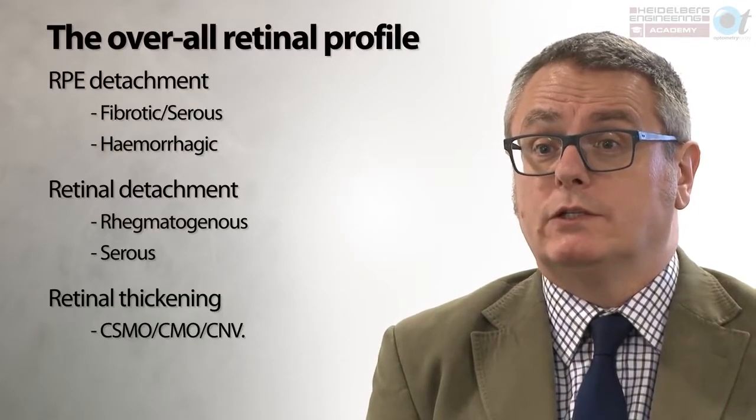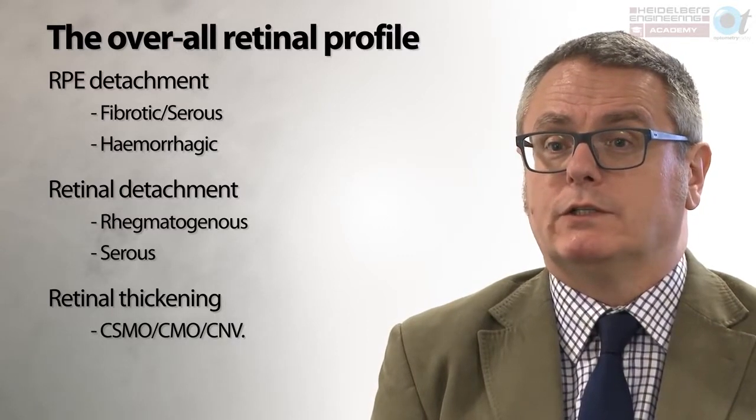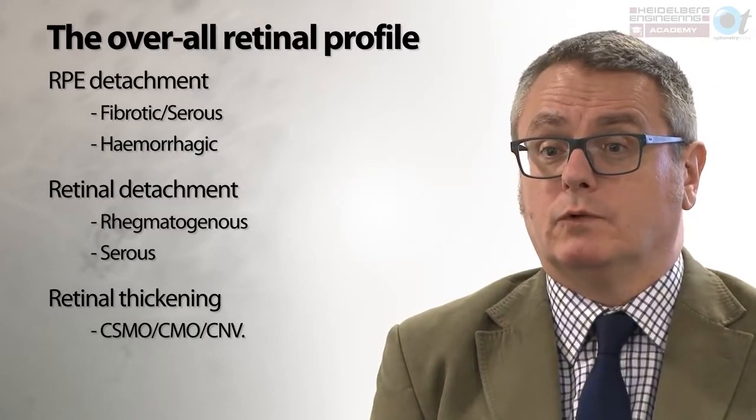What can cause changes to the overall scan profile? This list is not intended to be exhaustive, but this is the kind of changes you should be considering. Detachment to the retinal pigment epithelium, retinal detachment, and retinal thickening caused by macular edema.